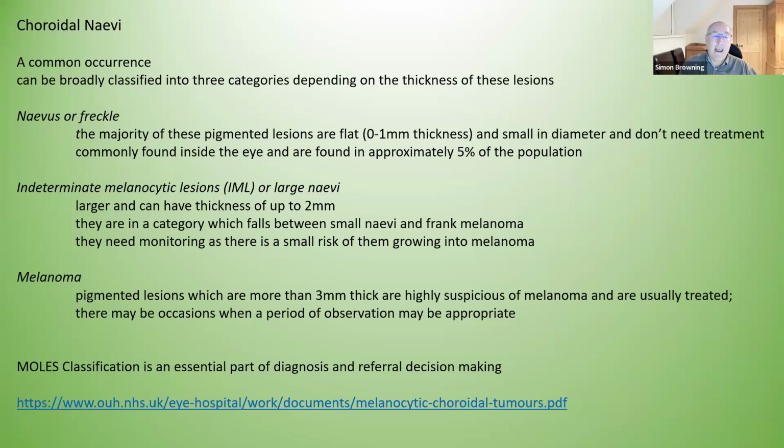And I think that's important to bear in mind here, because so many times using ultra wide field imaging and being able to look at the different layers and use of autofluorescence, you will pick up melanomas very, very early. And I think I might have told you of the letter I got from a consultant one time who said, "Would I stop sending in my melanomas so early in their existence?"